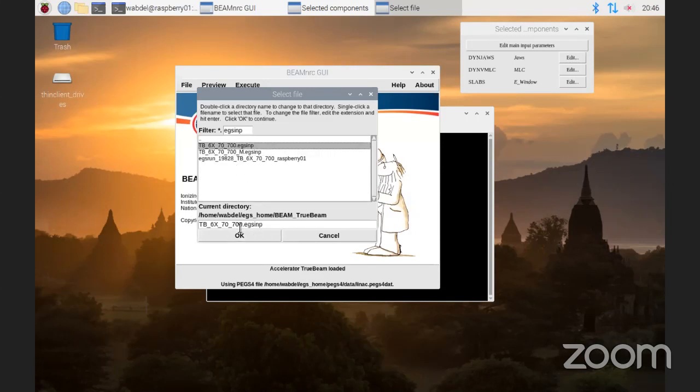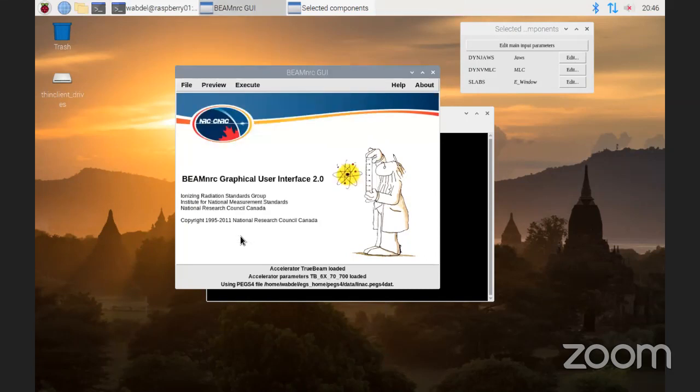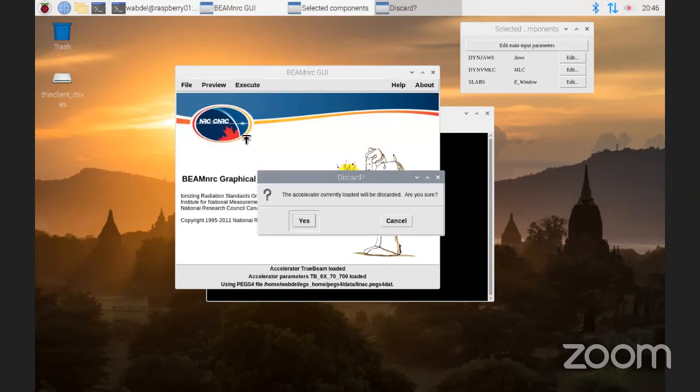Oh, I don't have that file there. Okay. Anyway, I will look into it because now we're reaching almost 2 hours. I will look into it more. But if someone has nailed this down, then I would really want to know where is their MLC.